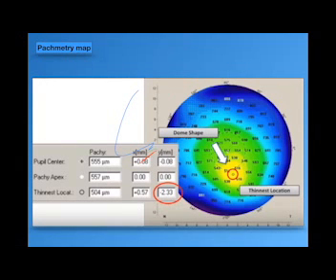If you found a patient with an inferior pachymetry map showing a point of 500, and in the same superior point, at the same circle, it's 540, it could be suspicious. Because the accepted difference between the superior and the inferior points in the pachymetry map is within 30 to 35 micrometer, respecting the difference between the superior and the inferior cornea.